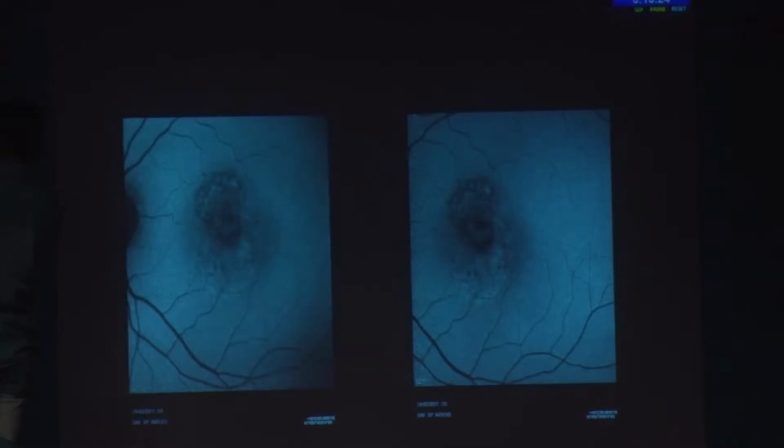What I found quite scary with that is that Dr. Manoj in fact showed that case with those red dots. And so I have in fact a question for you. When you see those red dots, you must be very careful, because you always think of hemorrhages when you see red. And actually when you see the actual color photo, you see it's actually black pigmentation. So I always get puzzled when I get only a Heidelberg photo done. Are we doing justice to this patient, or should we also get a flash photography?